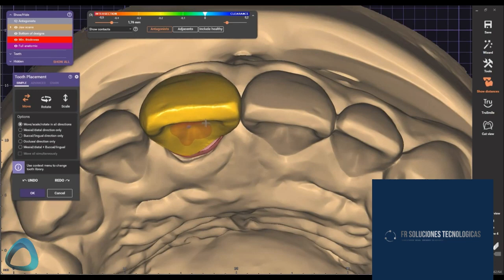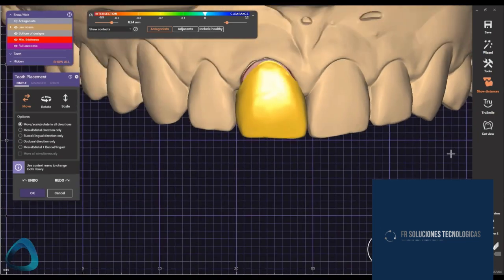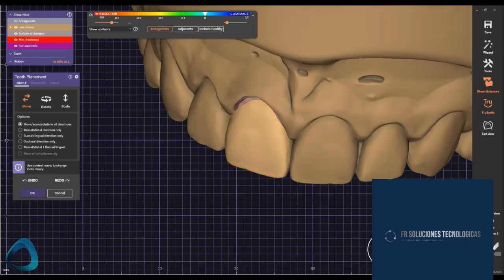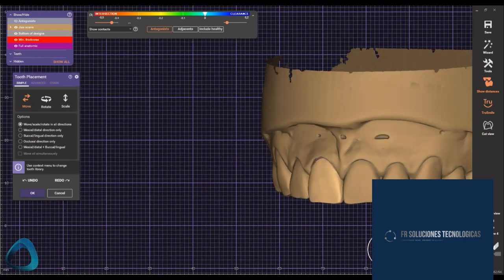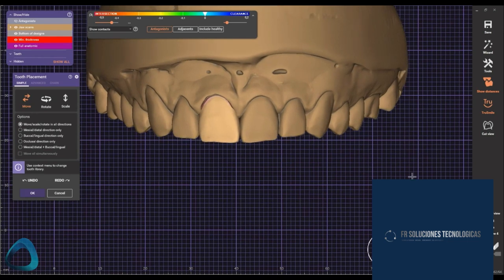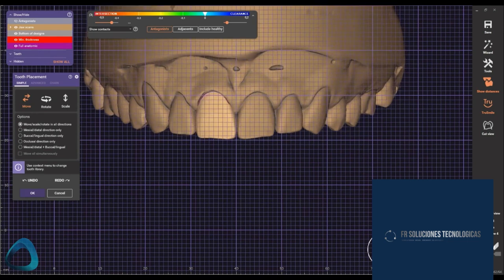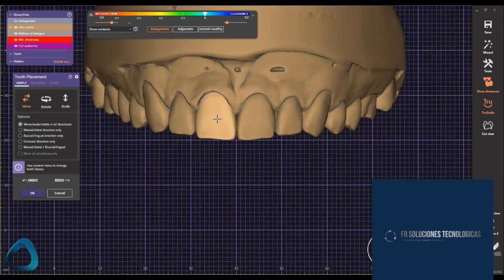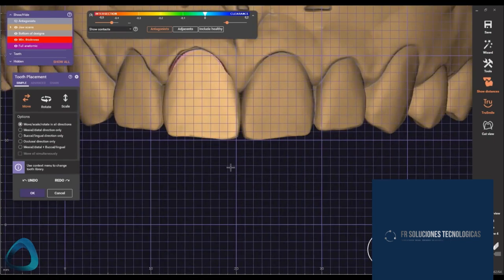If you have the True Smile module, click with the right mouse button and select Plaster. This will make your tooth model the same color as the jaw scan and help you see the symmetry. You can also bring the background grid to the front and use the squares to help you equalize both teeth. Hold Ctrl plus Shift and hit R button on your keyboard. Every time you click R, it will switch to a different grid mode.